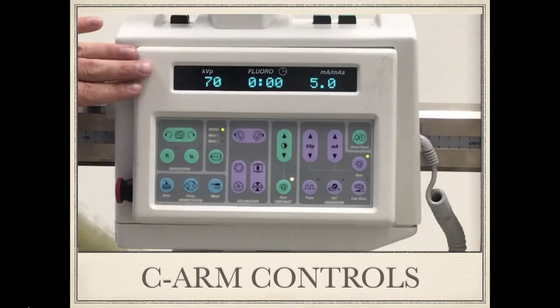If you move below that, to the section with the three buttons, the first button is for saving the images, and it clearly mentions that below the image. The second blue button down over there is for swapping the image. So if you want to see the last image on the other screen, you can swap the image from one screen to another. The third button over there is the mode button. This button is to switch directly into the subtraction mode.